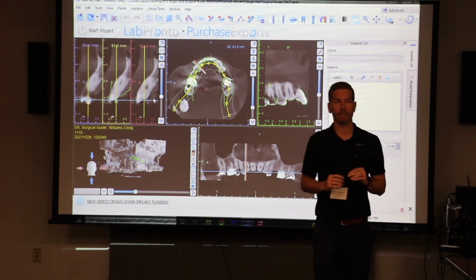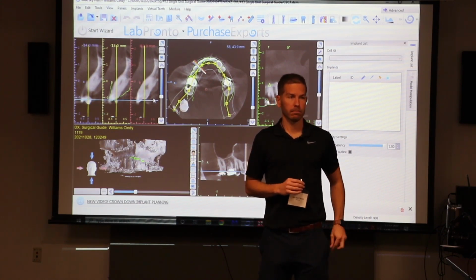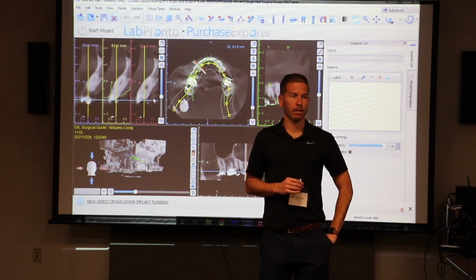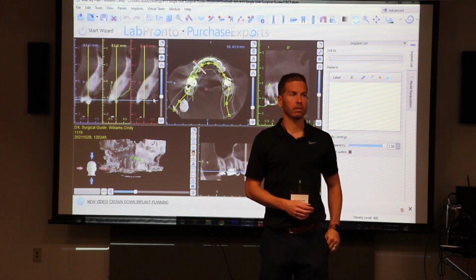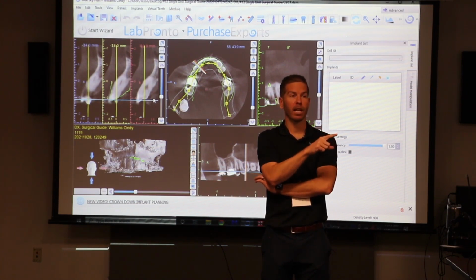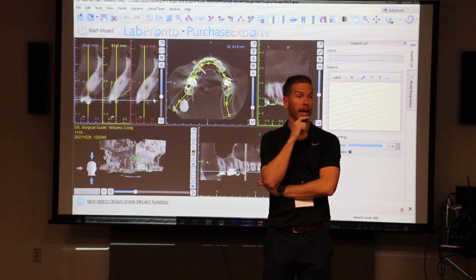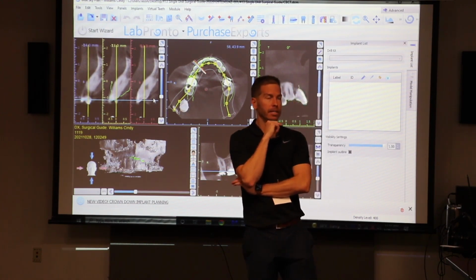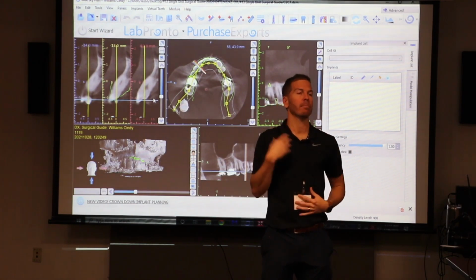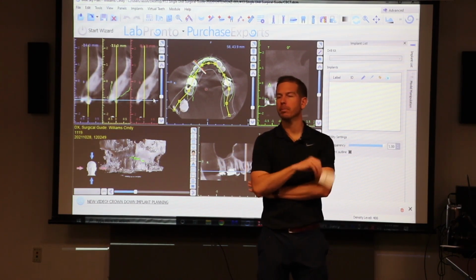Let's say if you're doing one on the upper and one on the lower, then it's 2 separate files, right? You cannot do upper and lower together because you selected maxilla versus mandible in the beginning, right? Yeah, I imported my upper STL and I told it was a maxillary one, and I haven't imported the lower one yet. But you can't do both together. You can, actually, you can. Yeah, no, you definitely can. So you can control select 2 and drop them both in. And often I do that, and then you just have to tell it which each one is. All right, any questions on alignment?